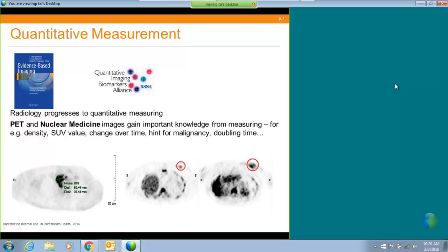And on this left image, you can see the diameters, the RECIST diameters. I will cover this one in a minute as well, but just as a note, it all combines into our lesion management solution. So a PET/CT is basically the home base of oncology reading. And of course, we would like to use lesion management tools in these settings.